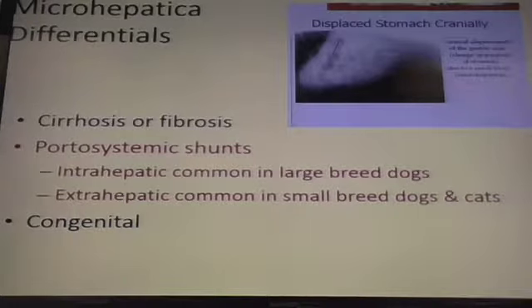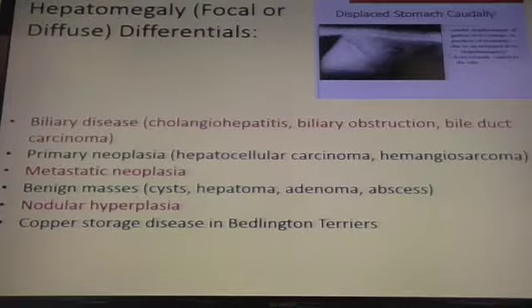Had it. Large breed dogs, small breed dogs, and cats. So just remember one or the other. And then they're born with idiopathic, congenitally small livers. Deep-chested animals tend to have small livers in appearance, but it's only because they're deep-chested and the liver and diaphragm have moved cranially.